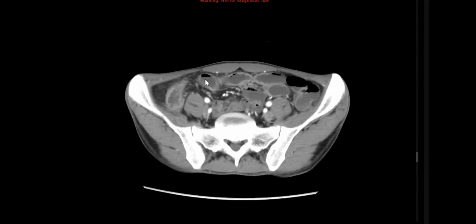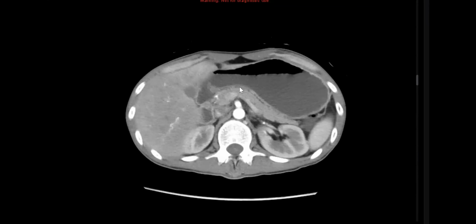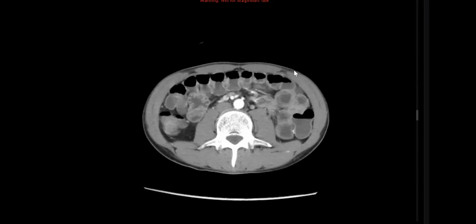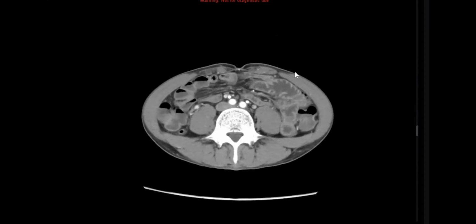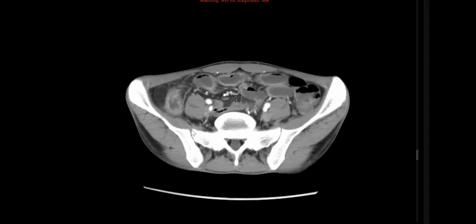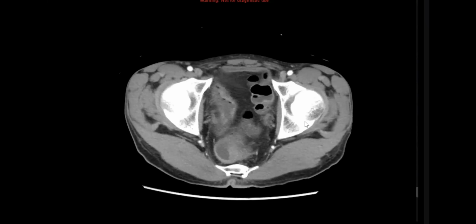Perforation, obstruction, stricture formation, and small bowel obstruction. And less likely associated sacroiliitis, gallbladder stones, complications, which is less likely to be malignancy. Gallstones, venous thrombosis, liver abscess. Very good. And lung window for any perforation. Bone window for sacroiliitis and also for any complication of therapy at the end, due to steroids.